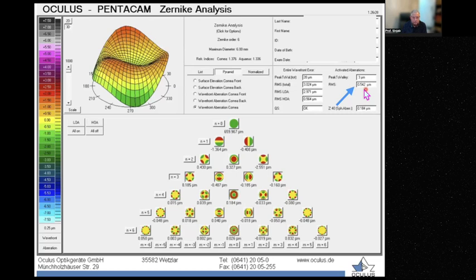Now, because the cornea is steep, you may think that the patient has steep spherical aberration. But this is not the case. Look at the spherical aberration, 0.184. And here, 0.184. So it is on the account of vertical coma, because it is vertically asymmetric, as we mentioned before. So this patient is suffering from coma.